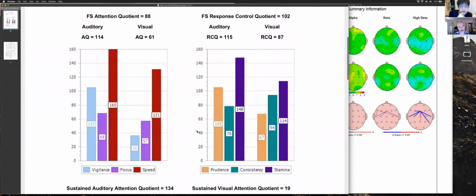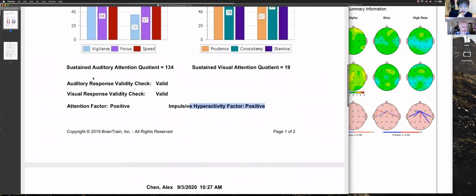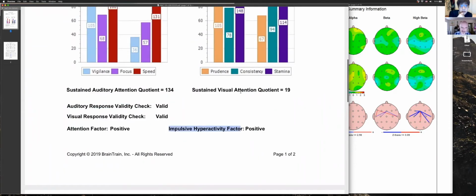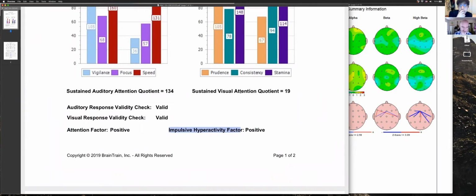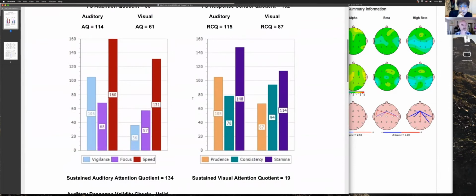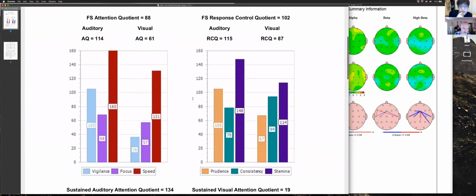This whole thing can be ADHD depending, but this is a population check on inattention, impulsivity. So ADD features and ADHD features. You show both. It's not a diagnosis. It's just performance. You can perform this way with a brain injury or fatigue or anxiety as well. Doesn't mean it's ADHD per se. It probably is with that much theta, by the way. But it could also be anxiety or a mix. Labels aren't ever as nuanced as people, right?